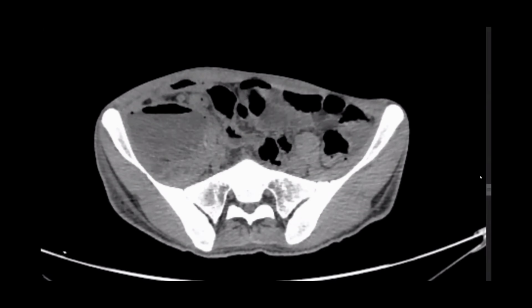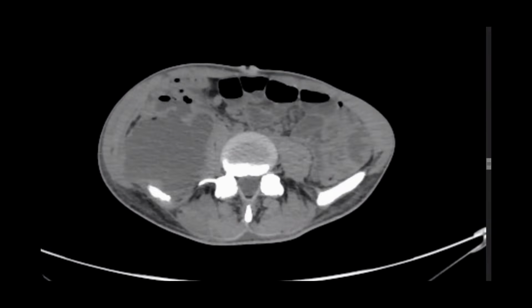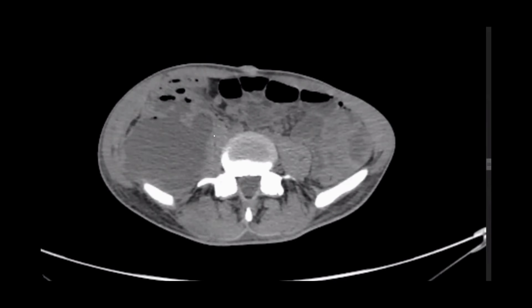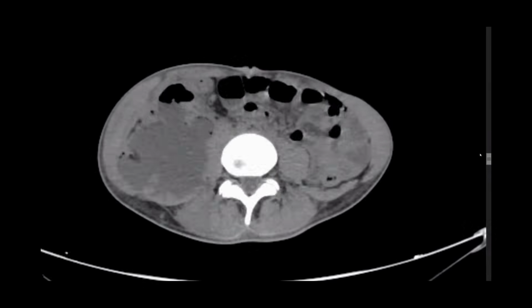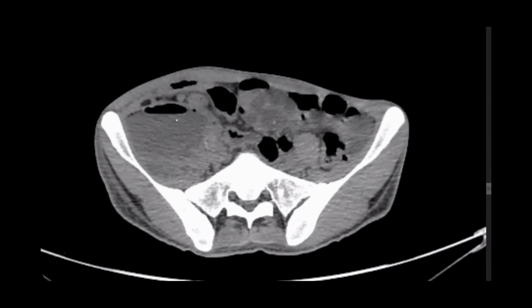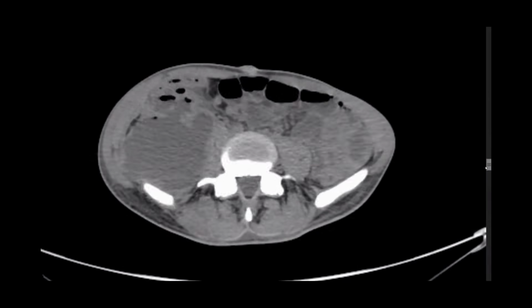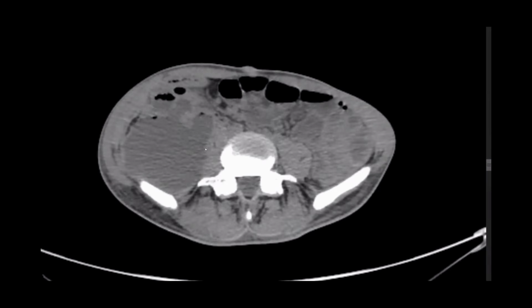Yeah, perfect. First comment for you: you did a very nice description. You told me that we have an irregular cystic collection centered upon the right iliopsoas muscle with gas locules and air fluid levels. And also we have something like an anterior extension for this mass.